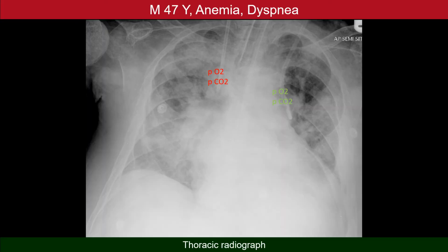One of the important points to consider in this situation is the abnormally good readings of blood gases when the sample is taken from the left central venous line. These values would be really too good to be true in a patient with respiratory distress as this patient, because in fact we are sampling here the pulmonary vein itself, which contains very well oxygenated blood.